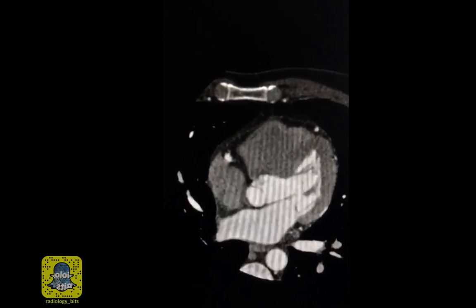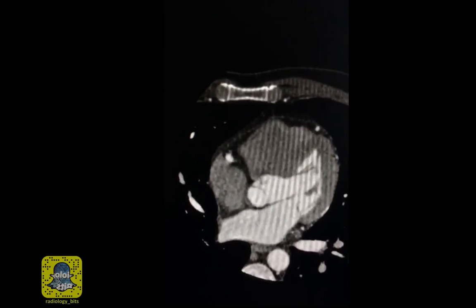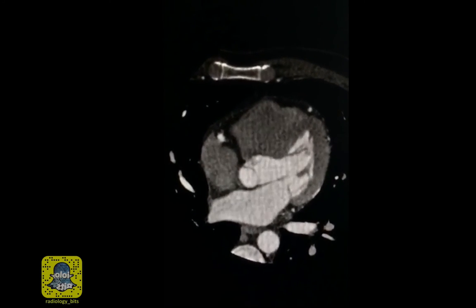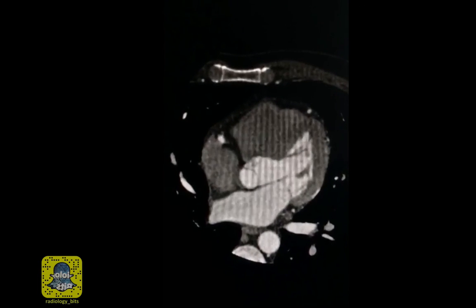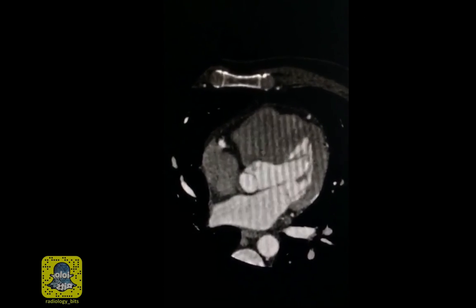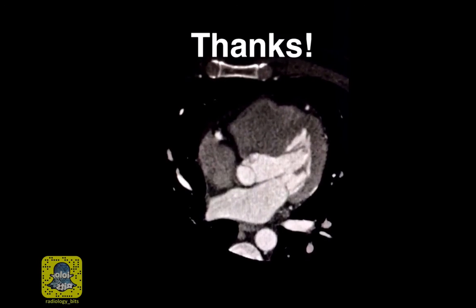Hopefully in future clips we'll talk much more about cardiac imaging by CT and even MR, since that's a very exciting topic. By the way, this is a patient who's 43 years old who presented with atypical chest pain, has no risk factors for coronary artery disease. His cardiac enzymes were not elevated and his ECG was non-specific, so his clinician did the CT scan and confirmed that he is normal. That's it for today's case.